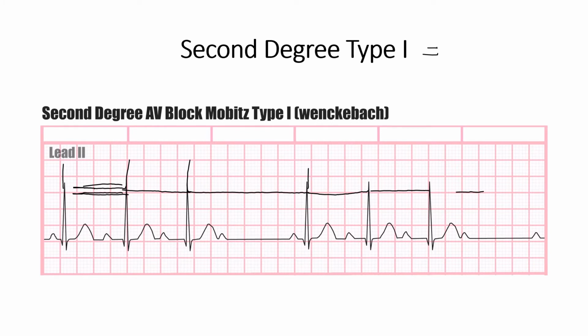And then look at this one. It sort of goes away. There's nothing. If you saw that there's a missing QRS there, you're doing great. And then coming over here, if you saw that there's a missing QRS, I would say, let's see, 1, 2, 3, 4, 1, 2, 3, 4, probably about right here. Yeah? Okay? So you are definitely missing some R waves in here. So that tells us we have drops.